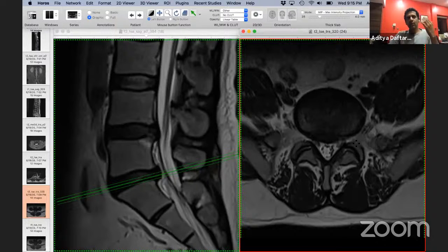So when you're looking at the lumbar spine or any spine, if you think about the process to go through, it's fairly simple. You start out by looking at marrow signal. Does it look normal? Does it look abnormal? Is it focally abnormal? Is it diffusely abnormal? Once you look at that, then you move your attention to the discs. Do you see herniations or not? Look at the facets and the ligaments. They give you a sense for whether there's instability or there's facet arthrosis.